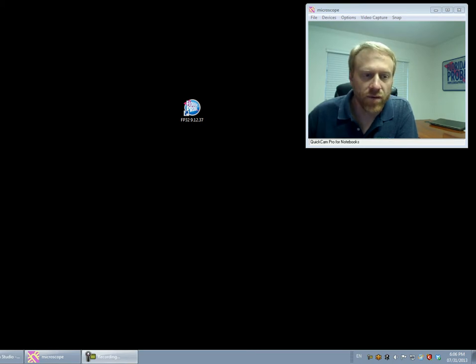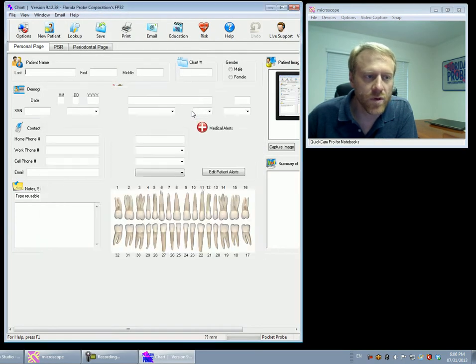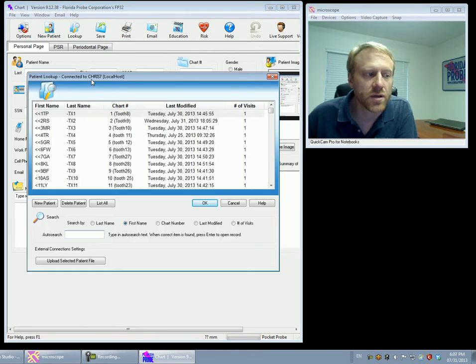Welcome to the Florida Probe training for research use. To get started as an overview, I want to click on the Florida Probe icon. Welcome to the Florida Probe. You're going to hear the welcome announcement, and then you're going to see the patient lookup list.